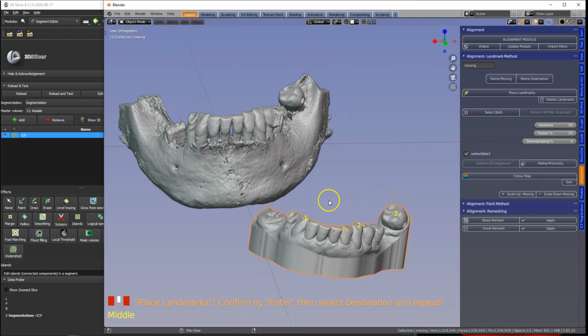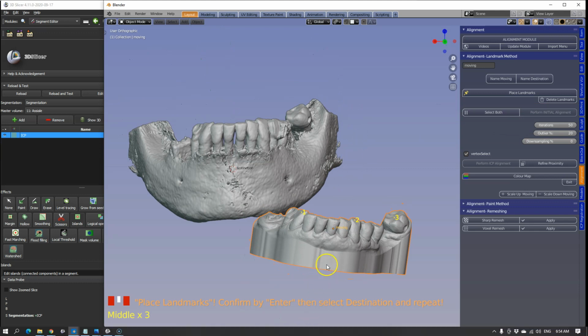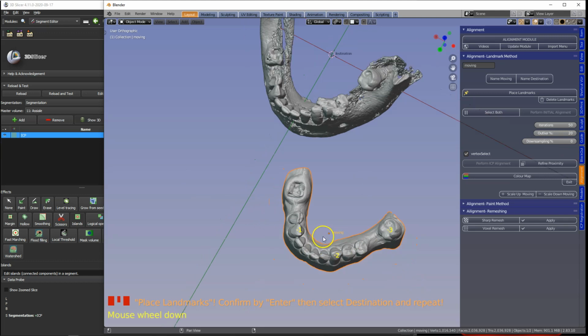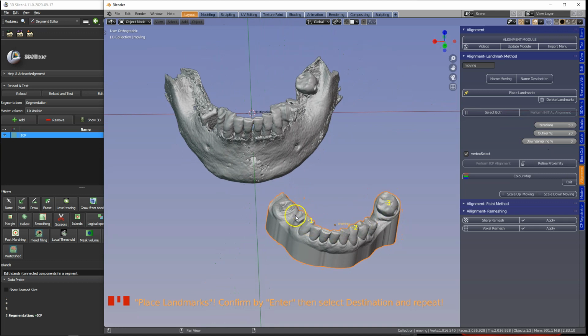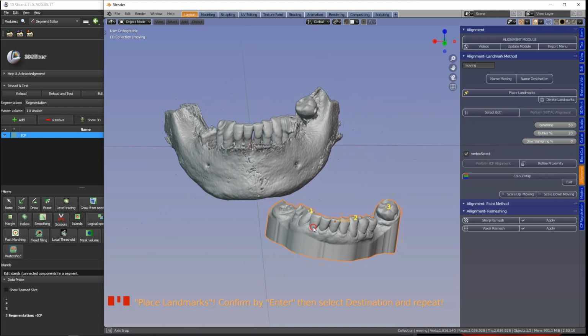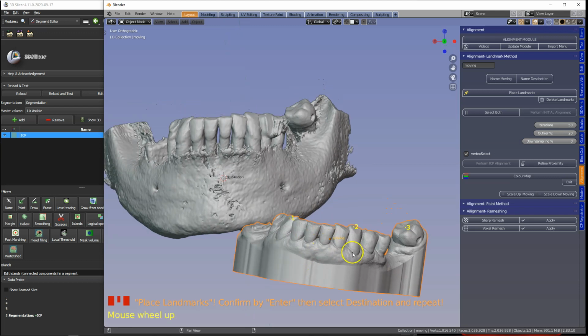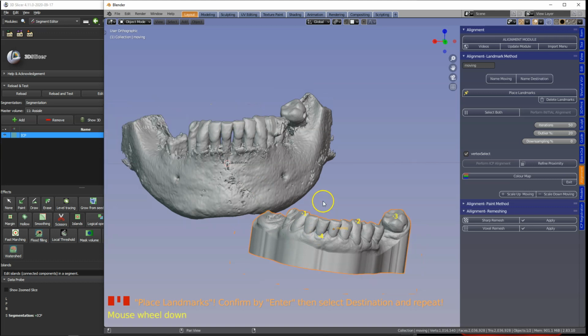Okay, so it is important always to think about the Z direction, which is this one, and the X direction and this direction. It's almost like we're trying to put a box around it. At the moment we have a plane on it. So let us select a few points, or maybe another one point, so that we can get the X direction. I'm going to select this specific point over here, like that.